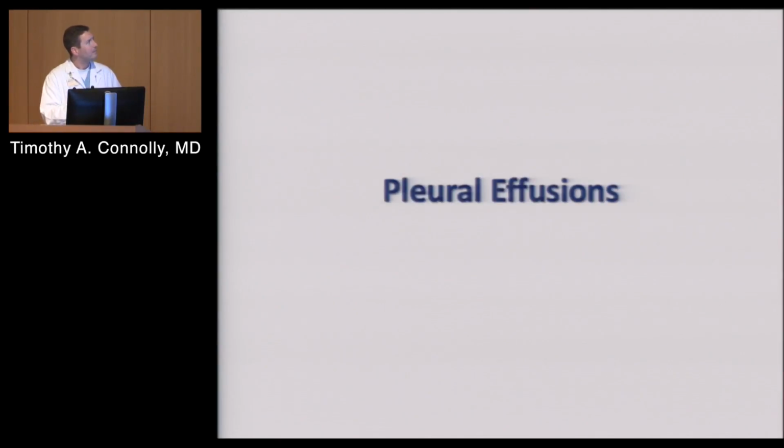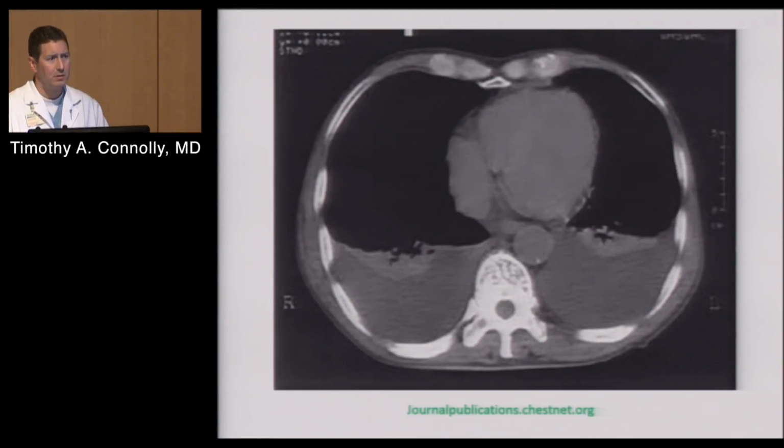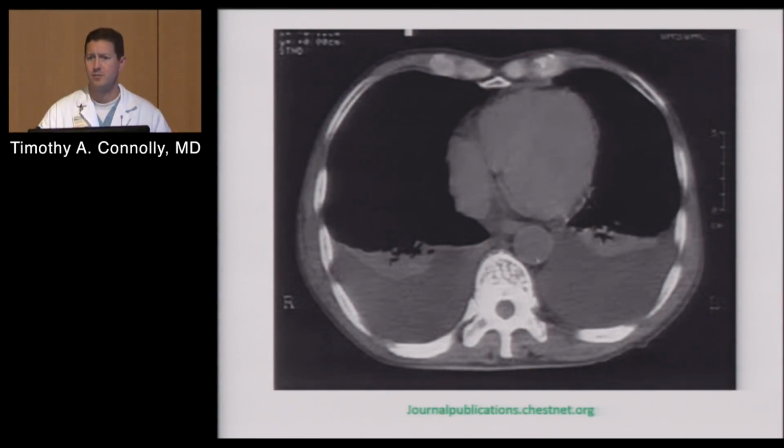Pleural effusions. If you see this on CT scan, this right here, this gray, and this gray on the mediastinal windows are classic pleural effusions. This right here is the collapsed lung, the atelectatic portion, because it's getting pushed on. Same over here. If you have someone who's not in immediate distress, don't send them for thoracentesis.